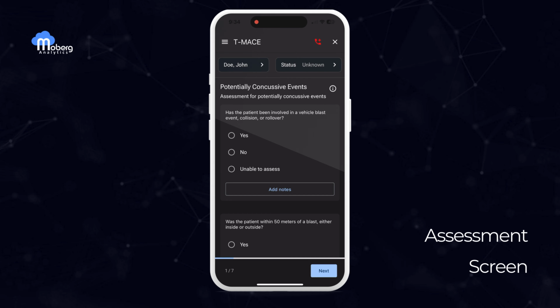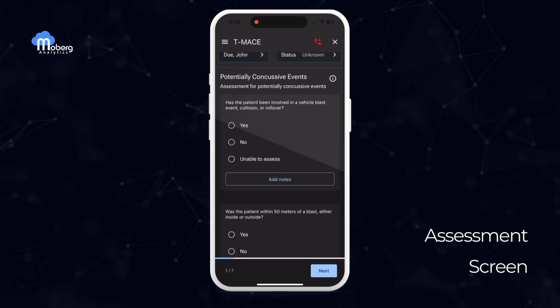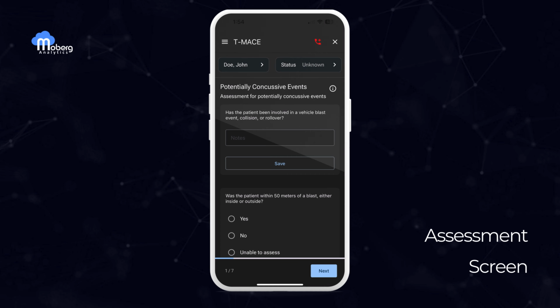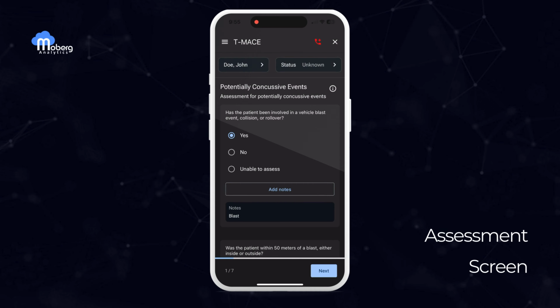Now, we're ready to begin answering questions related to potentially concussive events. The first question asks if the patient has been involved in a vehicle blast event, collision, or rollover. Each question has simple options like yes, no, or unable to assess. And there's an option to add notes for additional context.